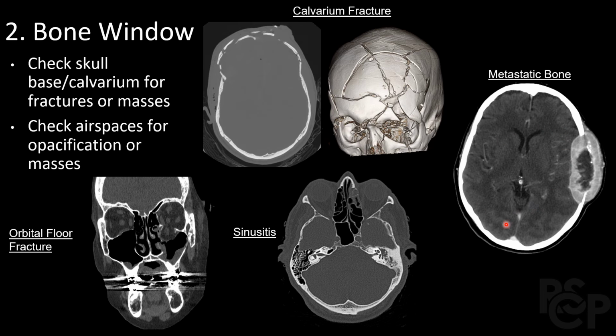So let's say this patient has a primary tumor and we suspect metastasis to their brain or the skull. This is an indication to administer contrast. And you can see along the left side of the patient's skull, there's a clear enhancing lesion, likely corresponding to a metastatic bone tumor. Enhancing is a terminology we use when something appears brighter after contrast administration.